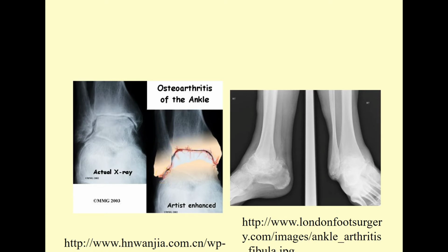First microcrack edema, followed by fissure and pitting, and then ending with a good chance at a loss of cartilage integrity or erosion phase. Here we have an ankle more seriously involved, evidence of debris, prominent loss of joint spacing, both tibial-talar, fibulo-talar, tibial-fibula. So a more serious presentation of DJD.